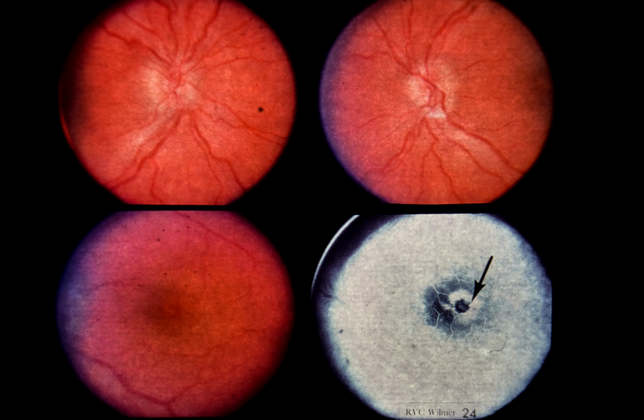Both optic discs are hyperemic and edematous. Lower left. The left macula shows cystoid changes that were more apparent on slit lamp biomicroscopy. Lower right. A fluorescein angiogram demonstrates leakage from the optic disc and parafoveal capillaries, resulting in a cystoid pattern in the left macula. Areas of white vitreous condensation adjacent to the inferior ora serrata were present in both eyes. This patient has pars planitis, characterized by intraocular inflammation, cystoid maculopathy, and optic disc edema.